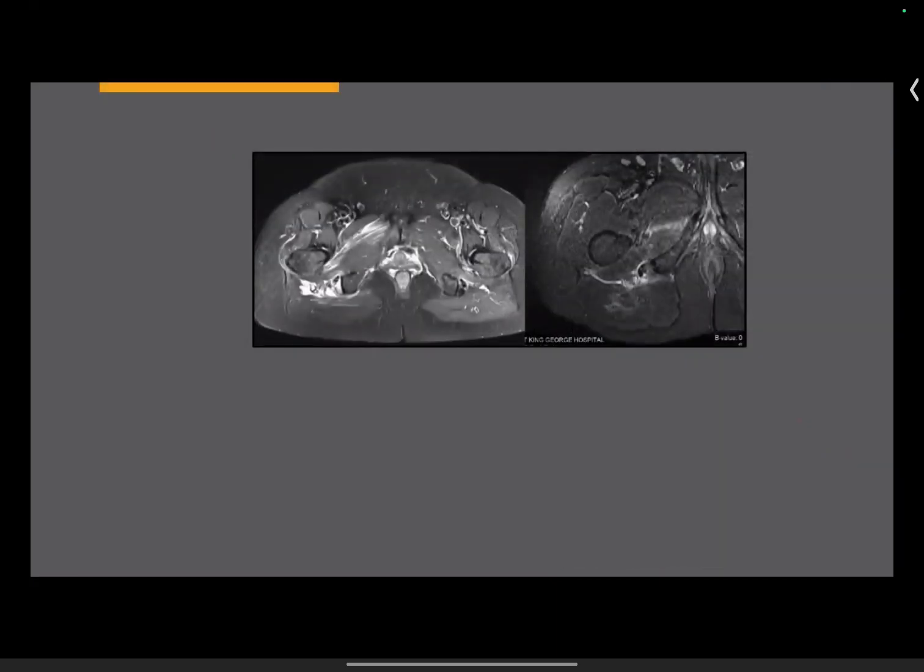Okay. Again, thinking about injury, patients present with a fall, unable to weight bear. The question is undisplaced hip fracture. X-rays are normal. CT is again equivocal or inconclusive. Then you end up doing an MR. Obviously, on MR, you're looking for marrow edema in the neck, like the case I showed you at the very start. But sometimes you don't find a marrow edema. All you find is muscle edema.